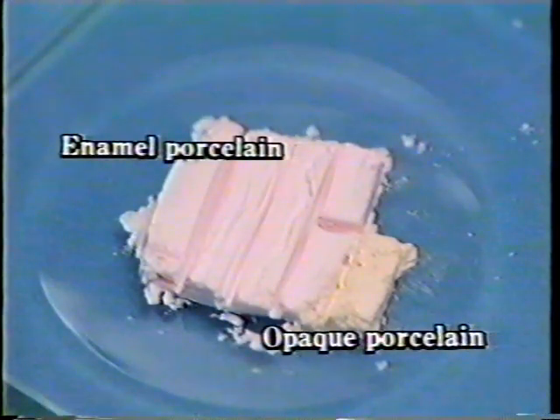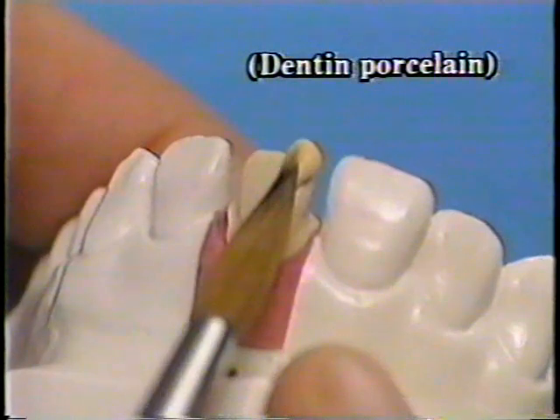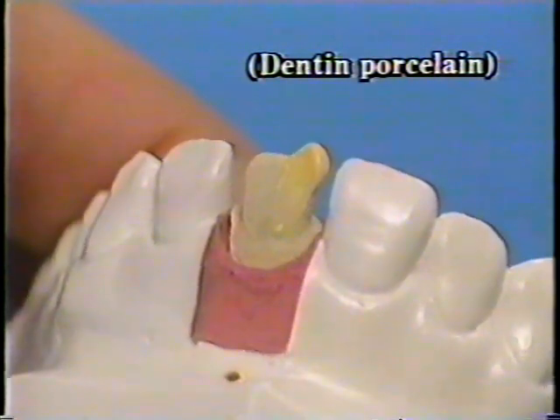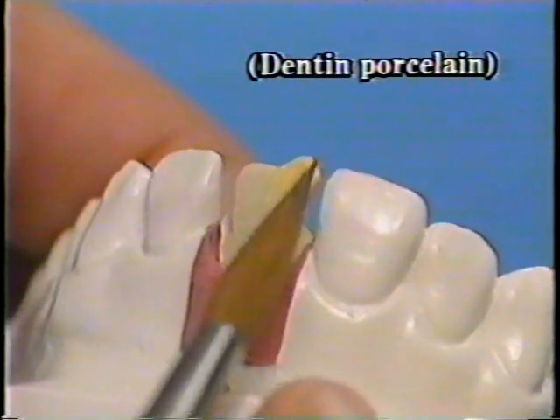To replicate as closely as possible the opacity of natural tooth dentin with a dentin porcelain, we'll mix a small amount of opaque porcelain with the enamel porcelain used for the dentin structure. This should give us the colored tone and harmonized anatomical structure necessary for matching the adjacent teeth.